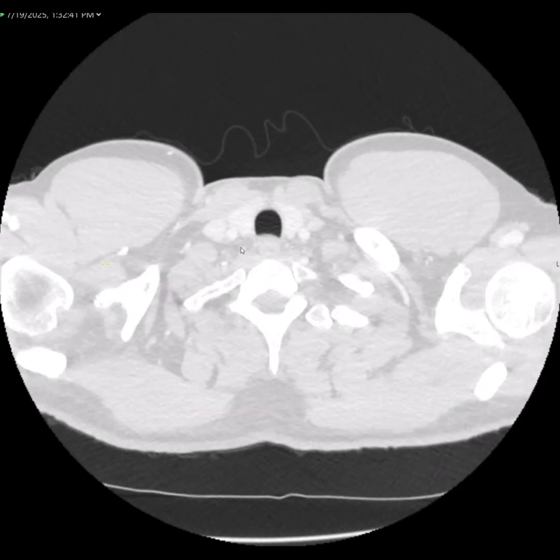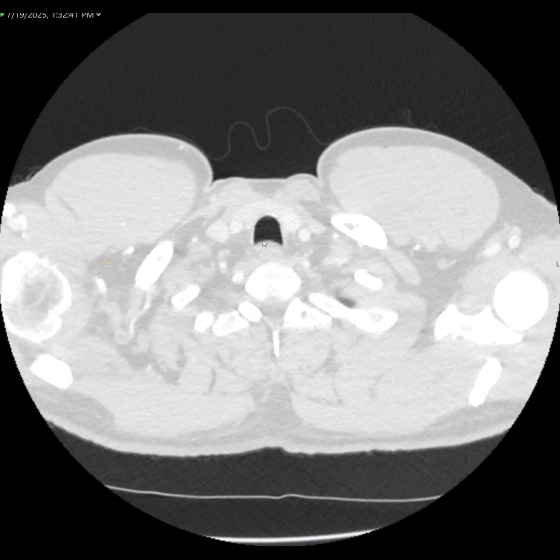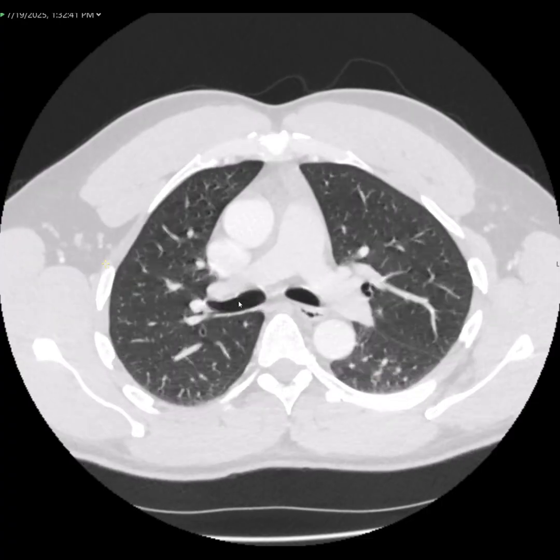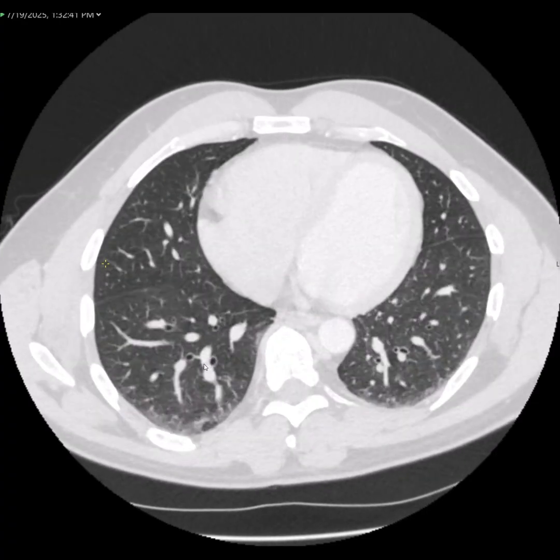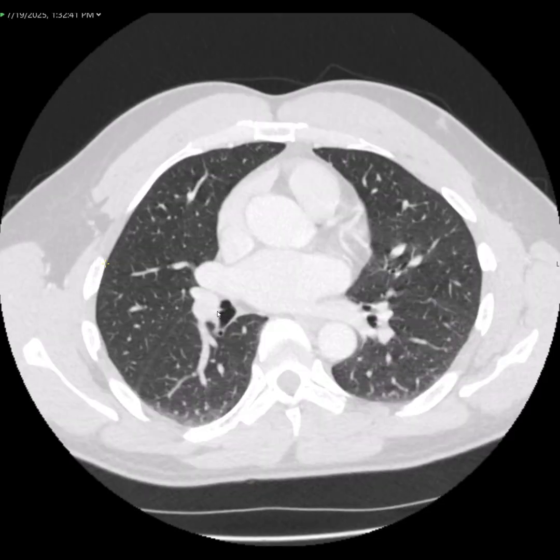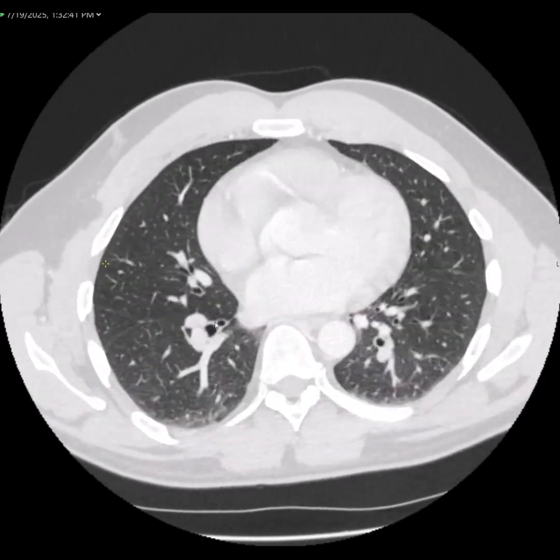Next, switch over to the axial image. You can shift over to the lung window. You're going to follow the tree of the airway down, starting at the top of the trachea. Here you can see some bowing of the posterior section of the trachea, which indicates that there's poor inspiration in this study. Following the trachea down into the right bronchus, into some of the right bronchi, just making sure that there's no occlusions or any sort of mucus plugging, any sludge suggesting any aspirations, anything like that. Here they all look normal.